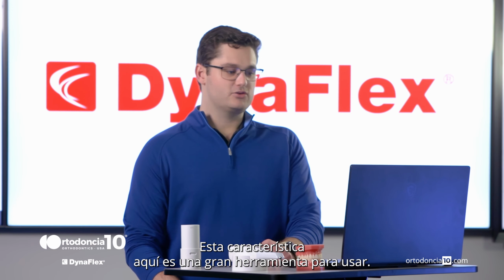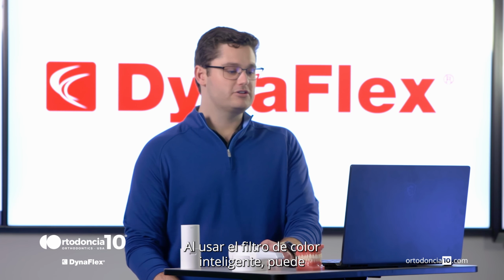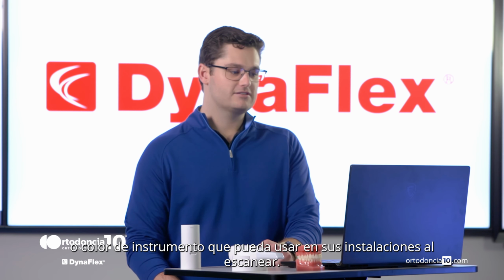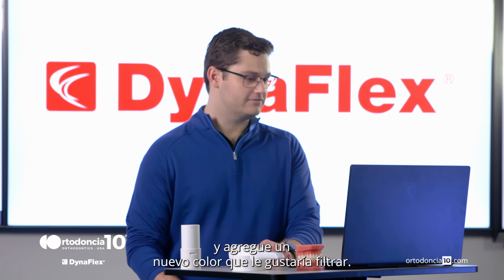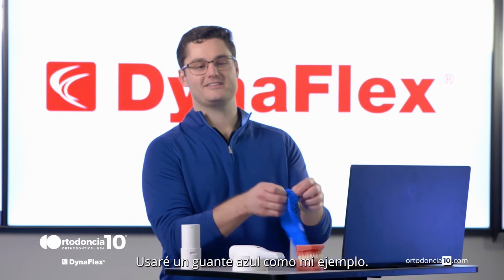This feature here is a great tool to use. By using the Smart Color filter, you can filter out any glove or instrument colors that your office may use when scanning. Click on this button and add a new color you'd like to filter out. I'll use a blue glove as my example.